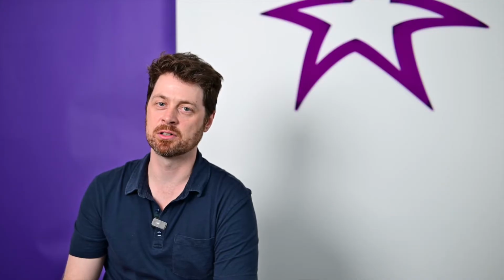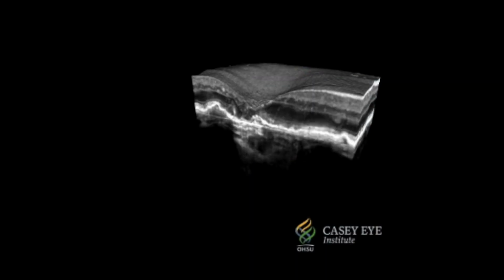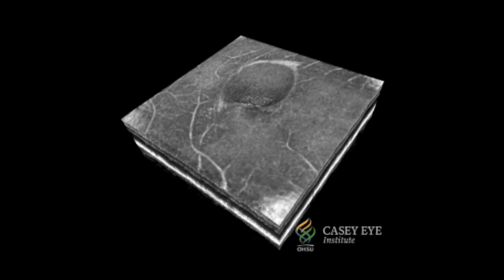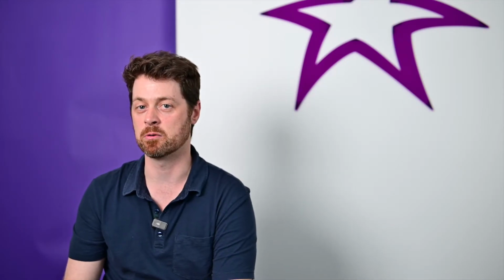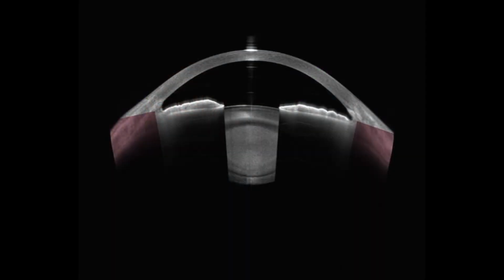Today I'll be talking about optical coherence tomography, or OCT, which is a method of imaging the internal structures of semi-transparent materials in 3D with sub-millimeter resolution. OCT has many applications in medicine and is routinely used in ophthalmology. OCT uses interference between light waves reflected from a sample arm and light waves reflected from a reference mirror in order to generate 3D depth-resolved structural images of eyes and other parts of the body.